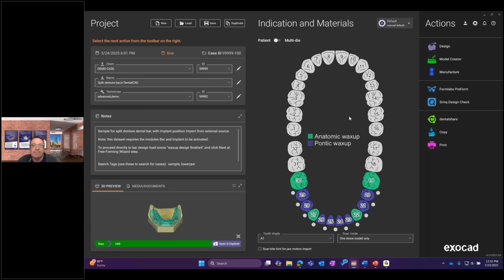There were some questions revolving around parameters, and the fit between the parts, which Lucas, you just showed, that there's the bottom step after the bar generation. There seem to be a fair amount of questions initially about the shape of the bar proposal with that first behavior you did.